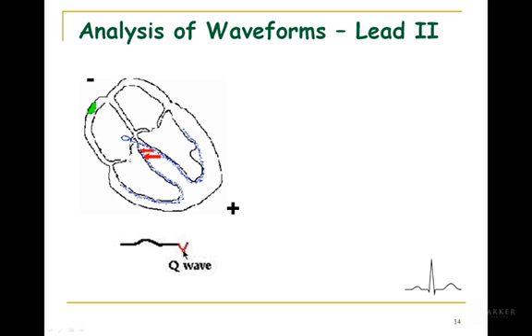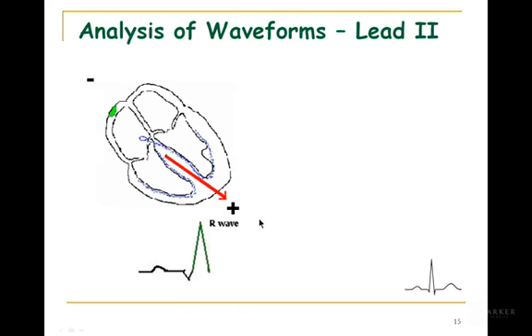Okay, so the Q wave is very small because there's not a lot of muscle, plus the fact it's running pretty close to perpendicular. If you don't see a Q wave, it is running perpendicular to the lead. Now the R wave is the big one. You can't miss the R wave. R wave, big, we got a lot of muscle. This represents most of the muscle fibers in your heart, from apex up close to the base. So it's the majority of the muscle fibers within the heart.